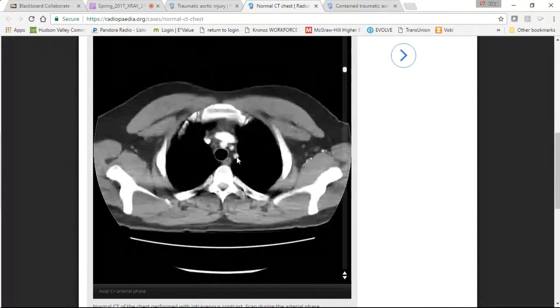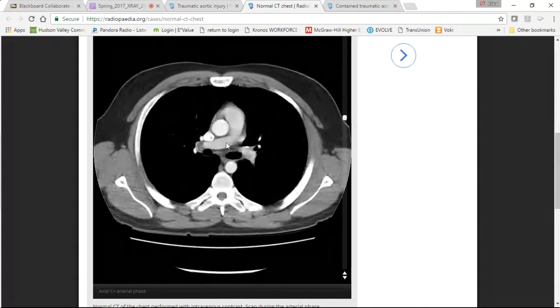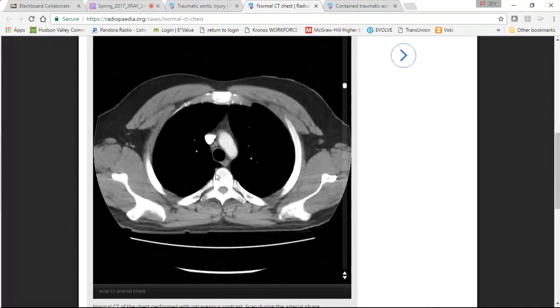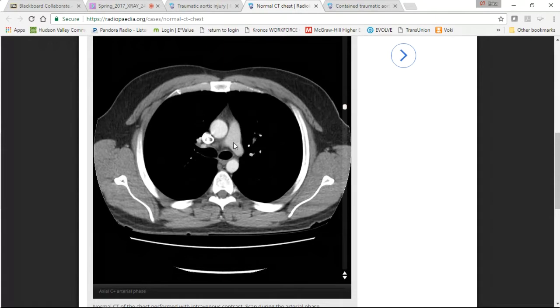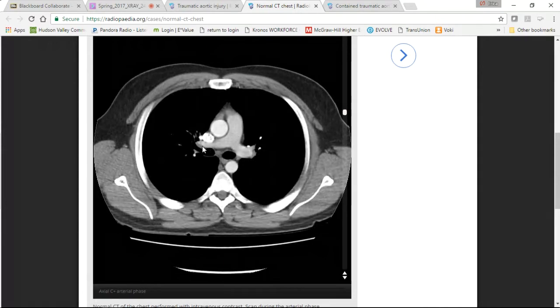If you're not sure and you can't just scroll down and say, oh, there's main stem, there's right branch, there's left branch, look for the carina, follow it down, follow your trachea down, first branch. The first thing that's going to pop up is your main stem, your main branch, and then it's going to kind of look like a guy running with his hair on fire a little bit, okay, with his two legs here. All right, so your right branch and your left main stem bronchi.